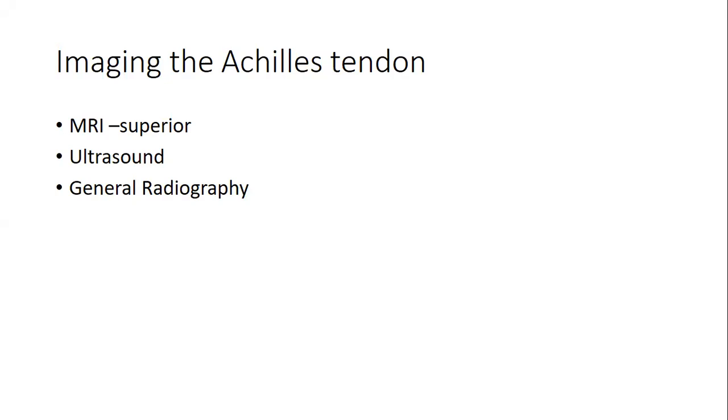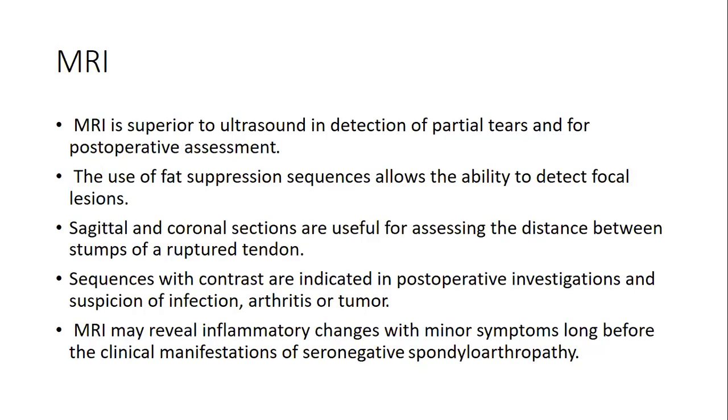Where MRI and ultrasound are not available, we can still do a lateral ankle radiograph, the conventional ankle joint. It may help to show the Achilles injury. Let's look at MRI.